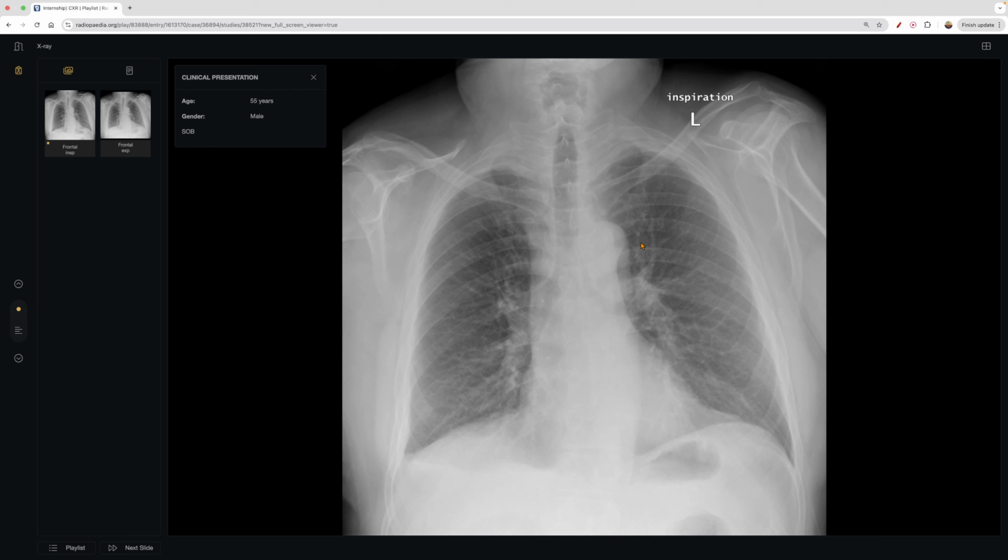So let's appreciate the ribs here. In an adult patient, maybe a little bit more challenging, but you can see the first rib, the second rib coming all the way across here, third rib coming across, and that's why it gets a little difficult to assess coming forward. So I like to go posterior. So 1, 2, 3, 4, 5, 6, 7, 8, 9, 10. 10 ribs above the diaphragm, and this is what the patient is presenting with. And this was read as normal.